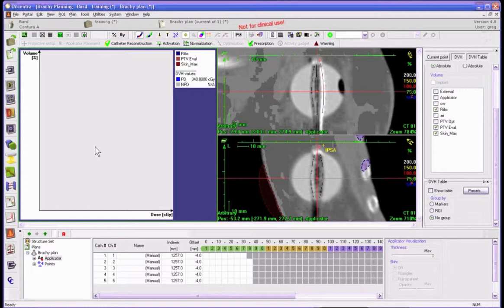And of course, in this case, it's not going to be very interesting because we're a long way from the skin. It'll be very low. And we'll put the rib dose. We would like to see that below about 140%, something like that. If you can keep it below 125%, you're really good.